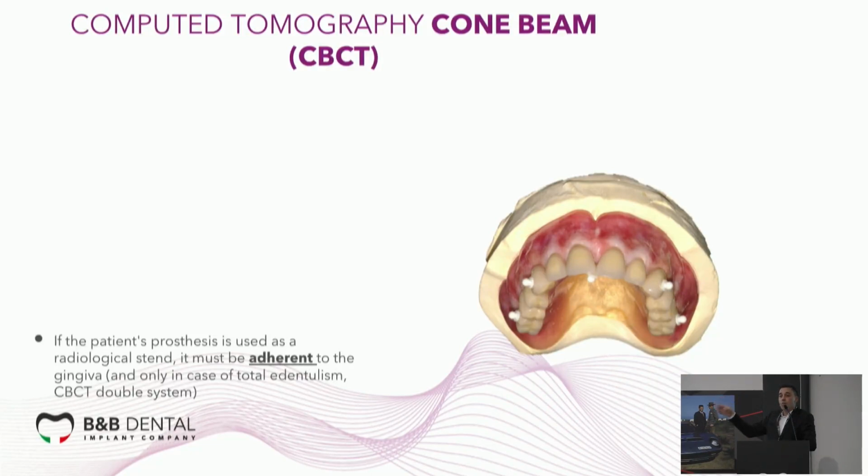After, with the help of our software, you can transform the DICOM files into an STL file, and you can use that STL file to obtain the gingiva. And in this case, you can match the radiological template, gingiva, with the DICOM files. And in this case, you don't need to take an impression.